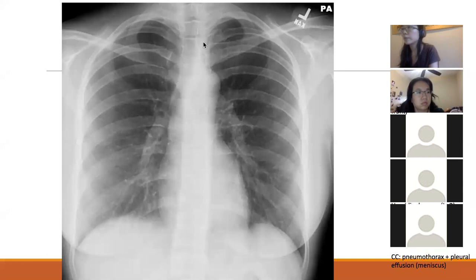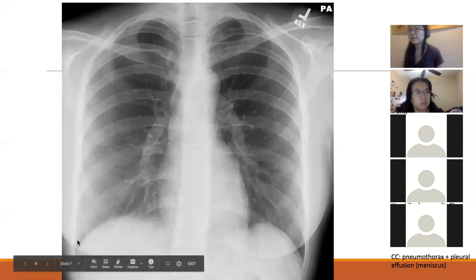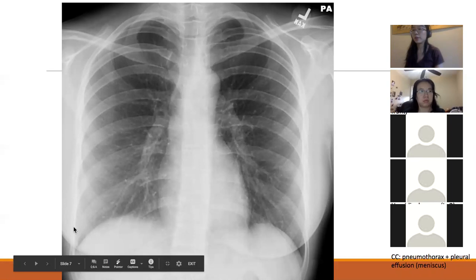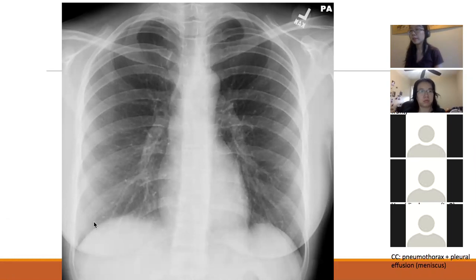So that would be the bronchus. It's really hard to see on this image. The last thing that I wanted to mention is that down here we have the costophrenic angles in the lungs. And these are clinically significant if you have a pleural effusion. So if you have a pleural effusion, then if you can imagine, if you're going to pour water into a cup, the liquid is going to collect down here and it's going to blunt those costophrenic angles.